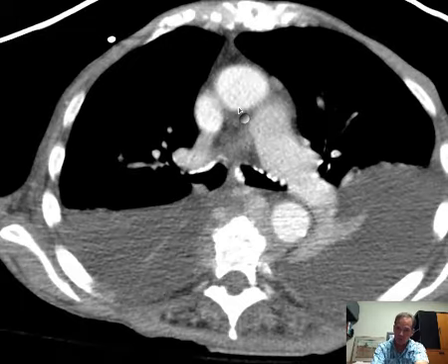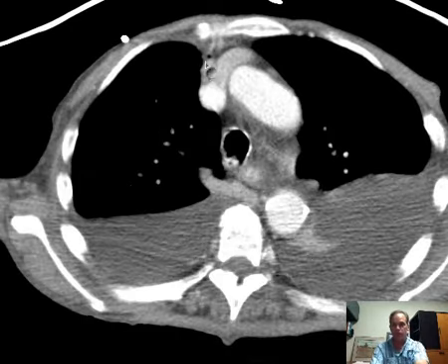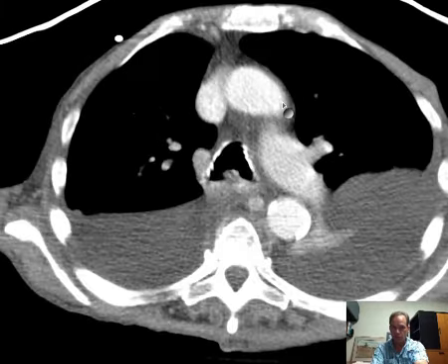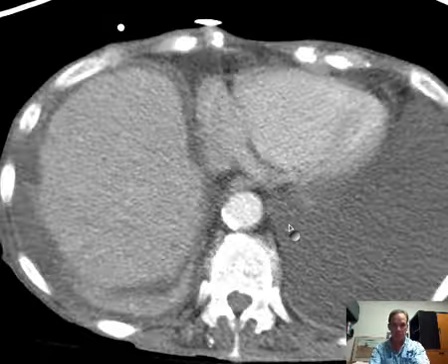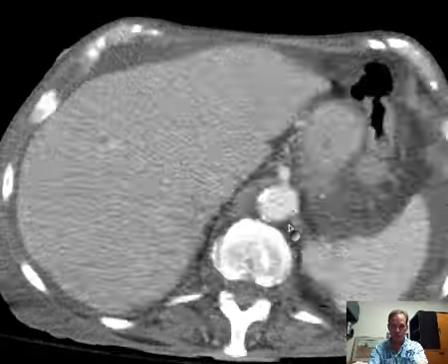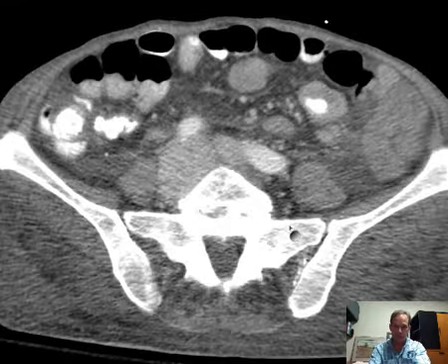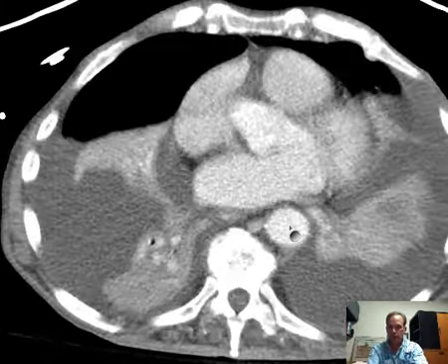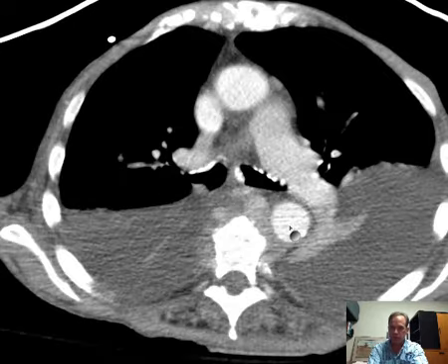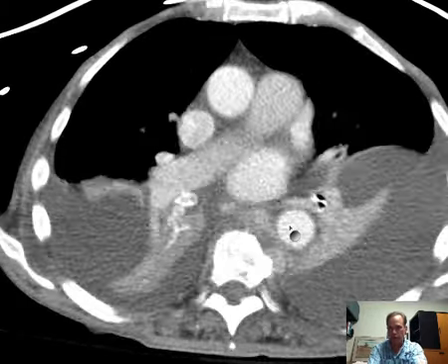So here is the aorta going up, up, up to form the aortic arch, giving off the vessels to the arms, the head, and then coursing downward as the descending thoracic aorta to enter the abdomen and then supply all the organs of the abdomen and subsequently the vessels of the lower extremities. So this anatomic relationship, I think, can be very helpful when you're looking at CT studies to get your orientation, to be able to describe things well.